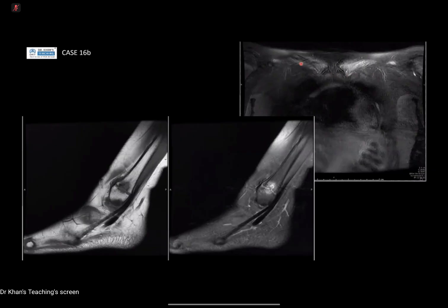So there's MRI here now proving that on the right side you've got abnormal marrow edema. You can't appreciate the periosteal reaction as well, but maybe there's elevation here and at the bottom, and also on the left side, so bilateral clavicular involvement. In your tibia, and your fibula, you know it's the fibula because you've got your peroneal tendons running along here. It's a metaphyseal region, along with the clavicles. You think, is this infection? But putting two and two together, you rightly got it as a CRMO.